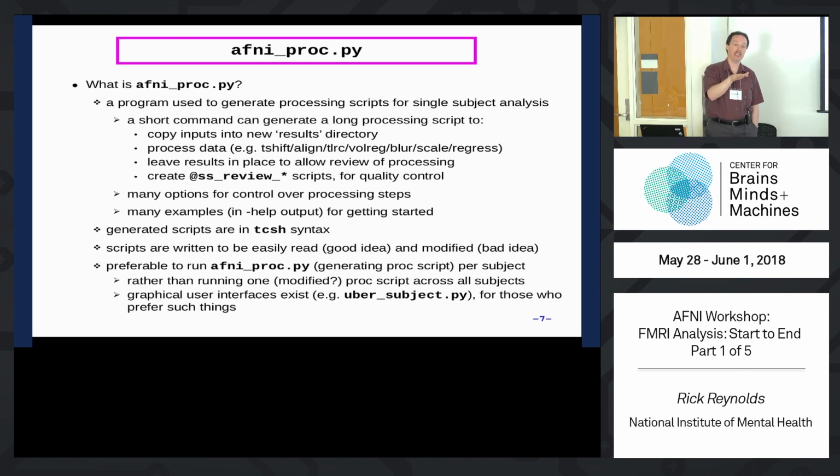So you should actually look through them to follow the steps that are being applied. If you want to really learn things well, you go off on your own, you type commands on your own following the script, try this command, see what it does, look at some of the other options that you might apply for that command, move on, and then when you're doing an analysis, you don't do anything by hand, you do everything with the scripts.